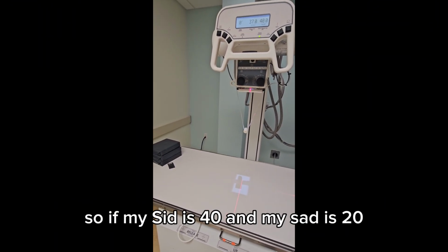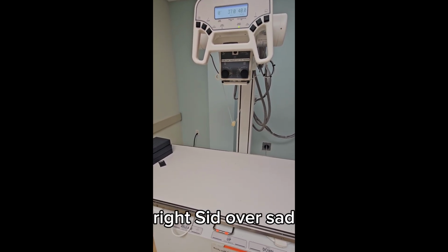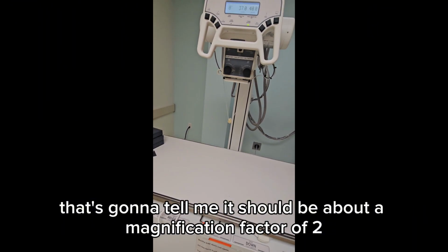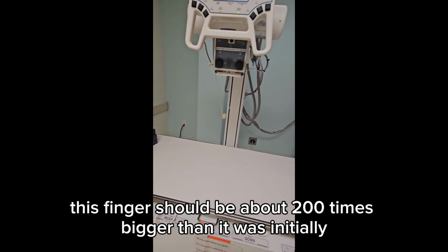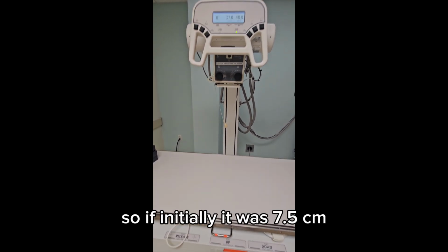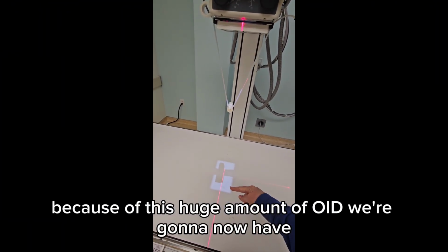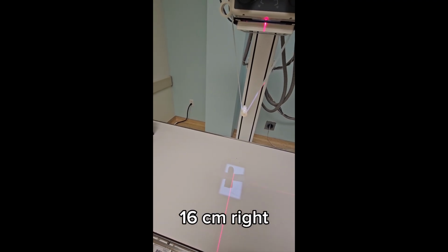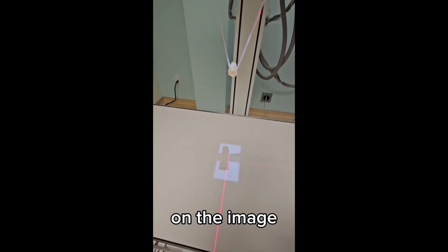So if my SID is 40 and my SOD is 20, right? SID over SOD, that's going to tell me it should be about a magnification factor of 2, which means that this finger should be about 200% bigger than it was initially. So if initially it was 7.5 centimeters, because of this huge amount of OID, I'm going to guess that that's going to be about 15, 16 centimeters, right? It's literally going to double the size of the actual size on the image.